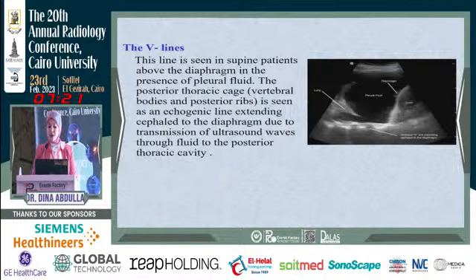In ultrasound examination, we could see that there is right-sided hemothorax. Internal air locules represent minimal internal pneumothorax. And in the image G, we can see the collapsed lung parenchyma with internal cavitary lesion showing air locule and air fluid level. This is either early abscess formation or complicated lung laceration. So it starts to appear as a cavitary lesion.